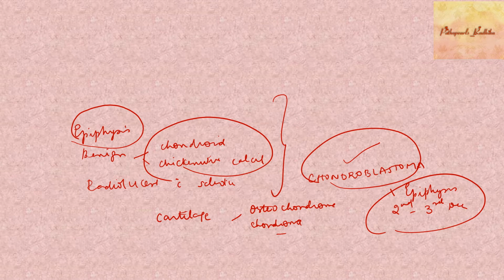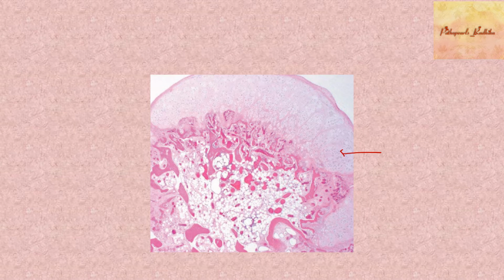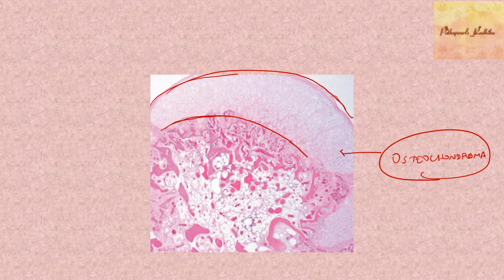It's a cartilage forming tumor. Okay, so what is this one? This is also a cartilage. See, this top one is a cartilage. Cartilage appears pink on histopathology. Sometimes it can be blue also. Here you have bone and enchondral ossification. This is how an osteochondroma looks. I have put osteochondroma here for you to compare and contrast. You would have seen these pedunculated lesions in the bones. Those are osteochondromas, which have a cartilage cap, then enchondral ossification, then bone. So just for comparison.